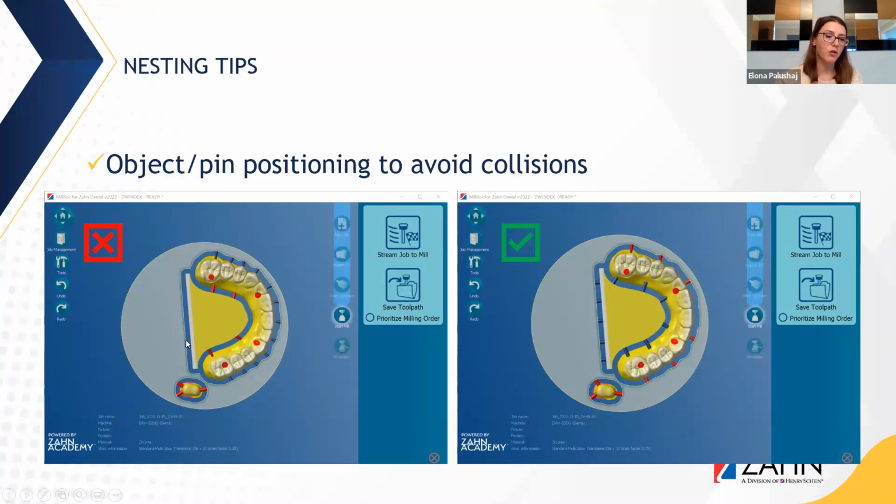And also very important that you always put pins in the back of the stabilizer. Otherwise, that weight is all dependent on whatever pins you have in the front. So what you see on the right is probably the best way to add those pins.